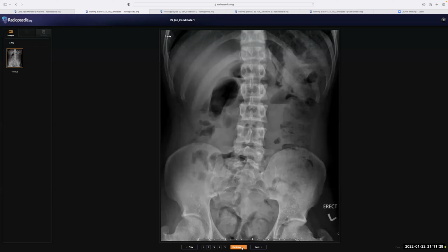Where exactly can you see them? So these areas, and in the left abdomen, I can see there is some lucencies over here as well. We cannot see your mouse, Dr. Asad. Can you see my mouse? Sorry. No, just click on the screen, and so it starts moving. Yeah. Okay. So these areas, and also over here in the pelvis. Otherwise, I don't see any evidence of pneumoperitoneum. No abdominal mass, no calcification.